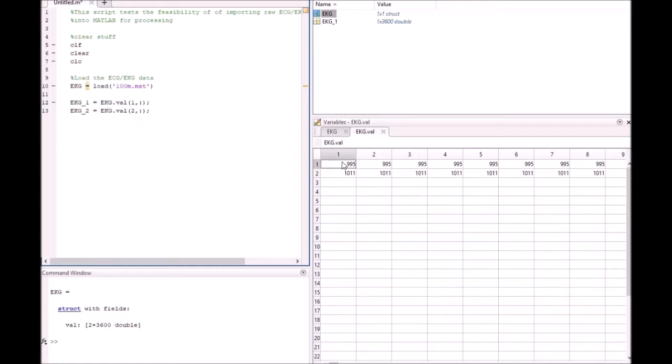I don't like working with rows. I like working with columns. So normally I'd switch this over, and how you do that is you just do something like this. You just hit that, and it would transpose it. But I'm not actually doing that right now because that's not that important.